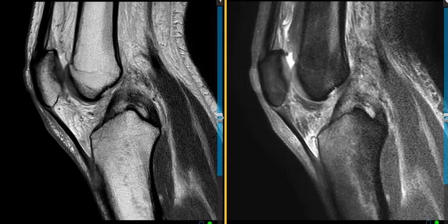And when we see this injury, we look for, let's see, the ACL. It looks normal on this midline cut. It comes from the back of the femur to the front of the tibia, so that's great. But we also look back here for this. This is called the posterior cruciate ligament, the PCL. It goes in the opposite direction here.